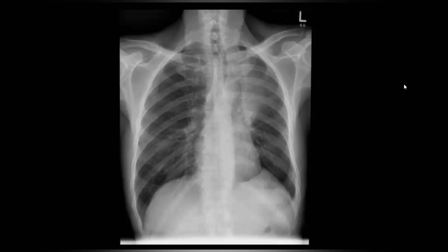So before we go to CT scans, what are potential causes of... do you hear me? Yeah, I can hear you. So this is a classic example of lobar collapse, okay? Lobar collapse is basic radiology. If I'm an examiner, even if you do your best in all cases, but you fail to recognize lobar collapse in the FRCR, this is a major problem. So excellent. This is an example of left upper lobe collapse, which shows the Luftsichel sign.